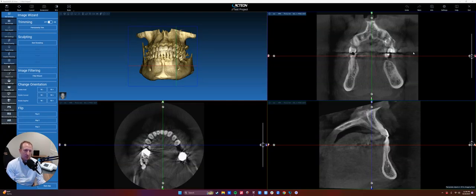Okay, so we're comfortable with the top toolbar, the main menu options, and now we're going to look more specifically at each patient panel, right? So on the left here, we have this whole subset, and depending on which software version you have or whether you have the add-ons, you may have probably just these top 8 panels. You may have some of the more advanced guided stuff and model editing things, but we're going to talk about these top 8, the most common that come with the main license.